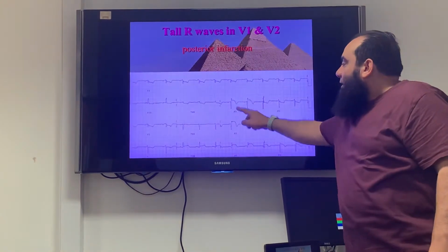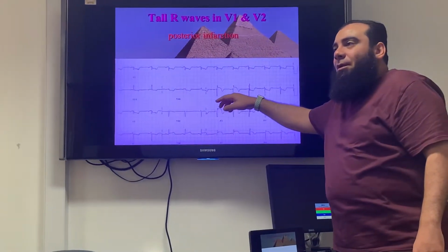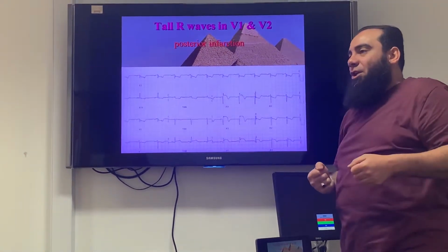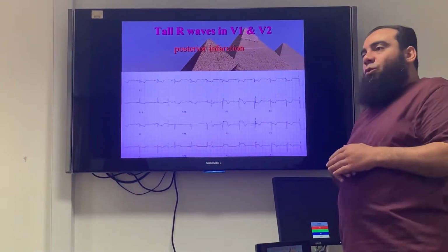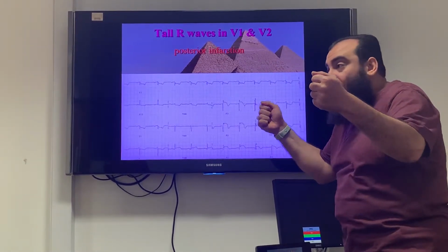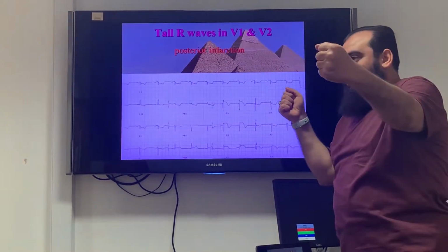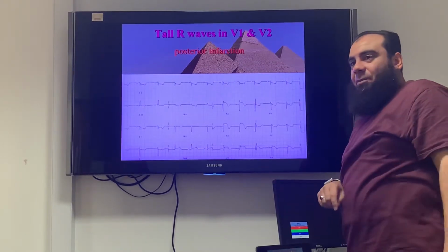Typical ST elevation in the same leads that had Q wave. Can you imagine? If we got a mirror of that ECG, we can see an elevation, which is one of the clues. We have to test it ourselves. That one is not another ECG, it is the same ECG. Hold it in our hand, we just rotate it, so we get the face to back, then 180 degrees. Then we can see that picture.